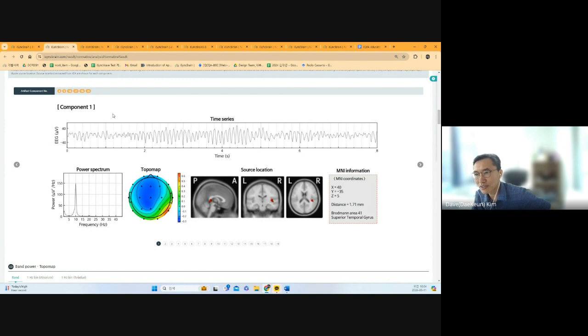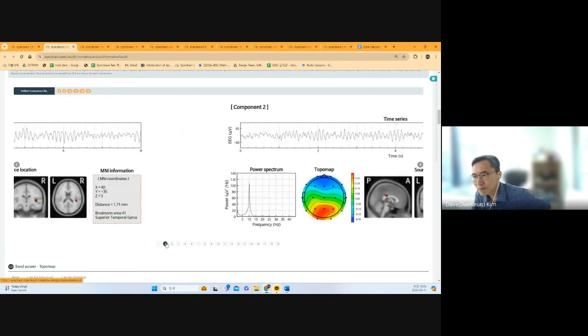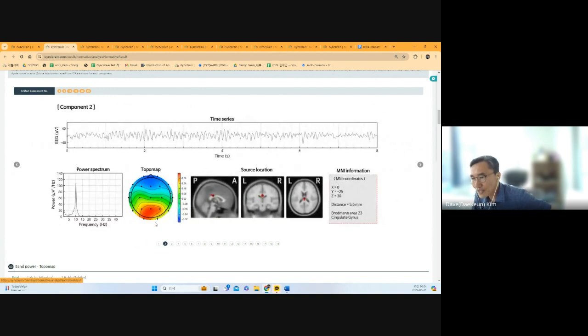The first component is the biggest effect at the sensor level EEG. So T6 alpha is largest, depicting her emotional trauma, and the second one is the cingulate alpha activity. The cingulate alpha is midline, posterior and just above the horizontal line. That's the typical alpha activity, the healthy component.